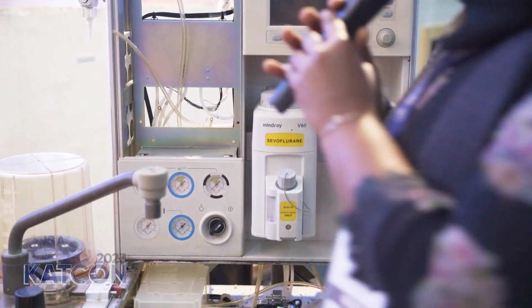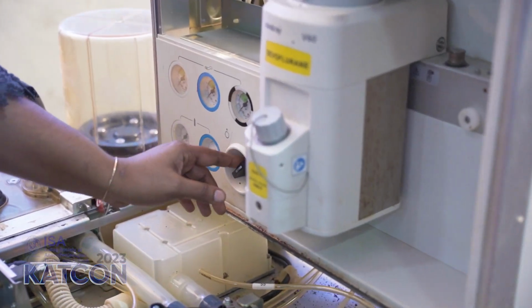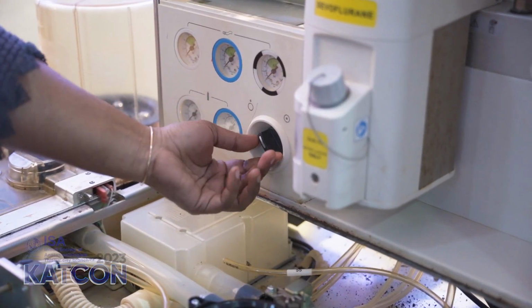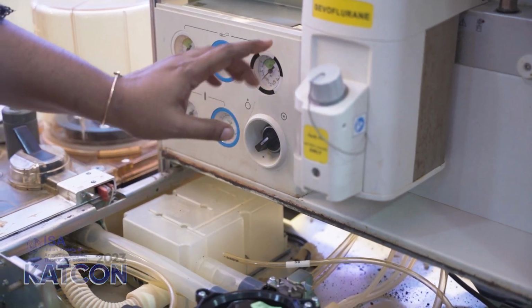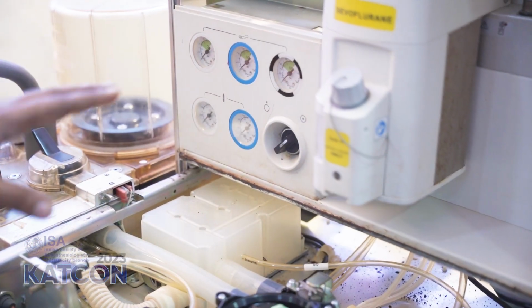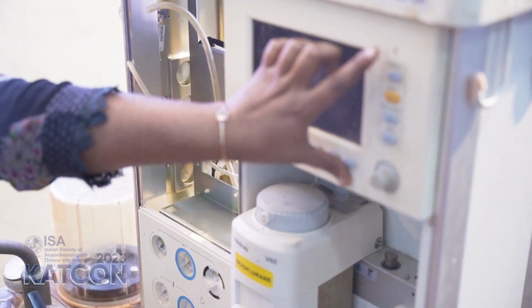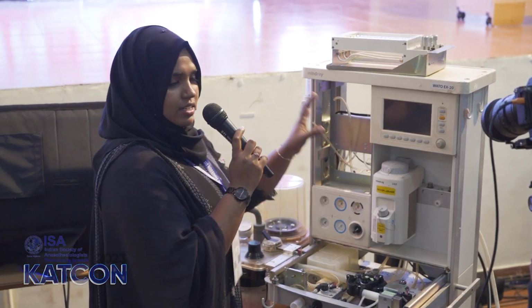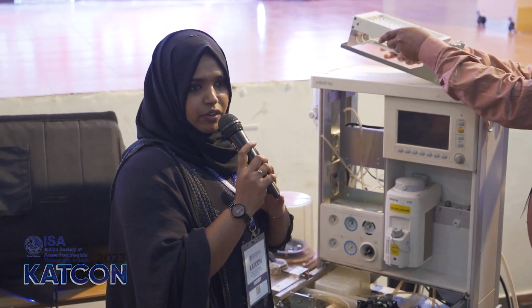Once we enter the OT, we should check the power switch, which comes under the electrical component of the workstation, whether it is on or off. And the power light indicates whether the power is supplying to the machine. And the other thing is that here it indicates whether the machine is connected to the power or has the battery reserve. The battery reserve is very important because if there is any power failure in between, the machine should not shut off.